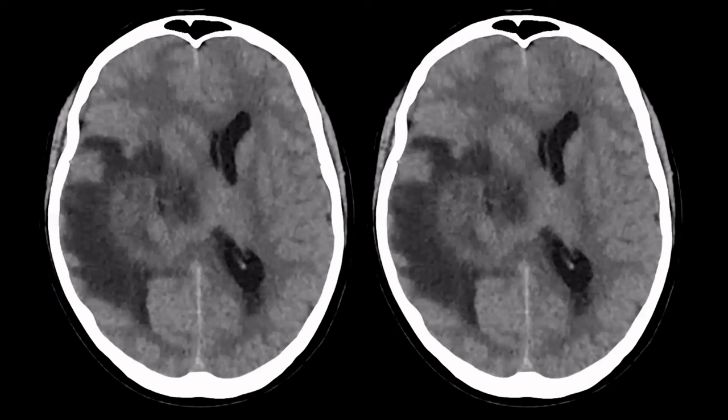Another kind of herniation, well, not right away. What do we see in this patient? Clearly something is going on in the right cerebral hemisphere. We have here a large space-occupying lesion, and this was a glioblastoma, a very malignant tumor of the brain. It is surrounded by hypodense brain edema, and notice how the cortex is not involved by the edema. This is a sign that we are not dealing with an ischemic infarction, because in an ischemic infarction, we would have loss of the gray-white matter differentiation. But that's not so important right now. We are going to talk about herniation.